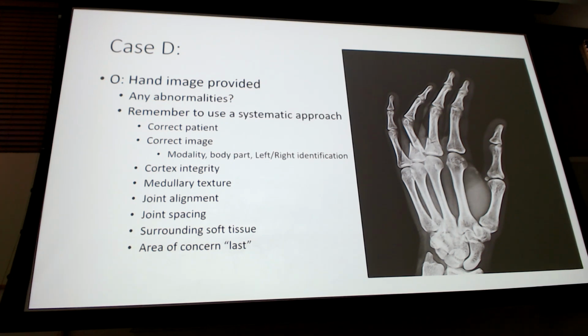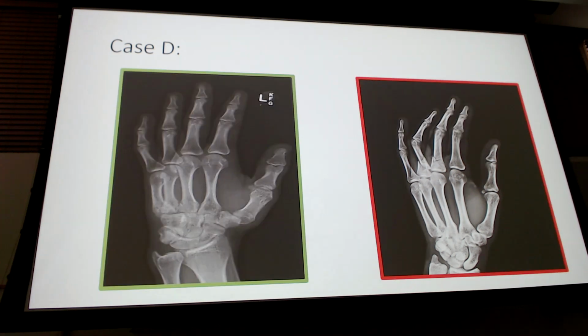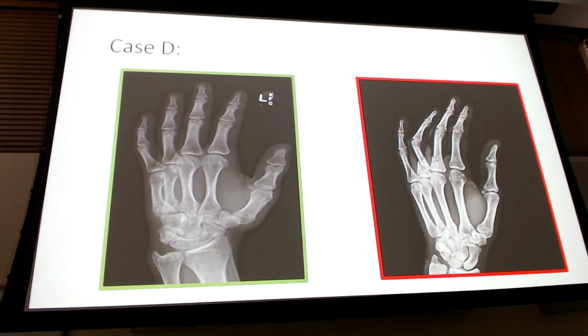Here's your x-ray. More time. Good. Here's now comparing it to a normal X-ray. All right.